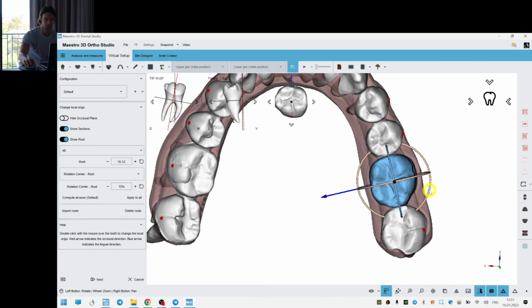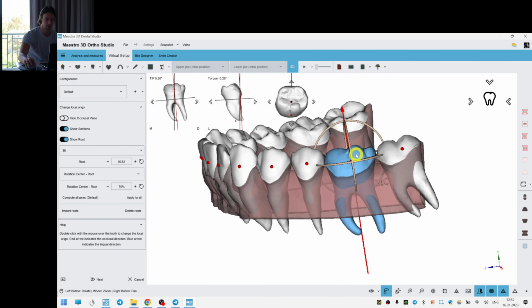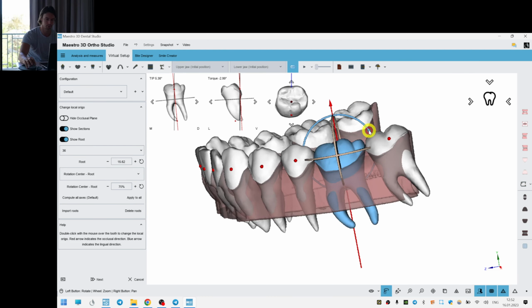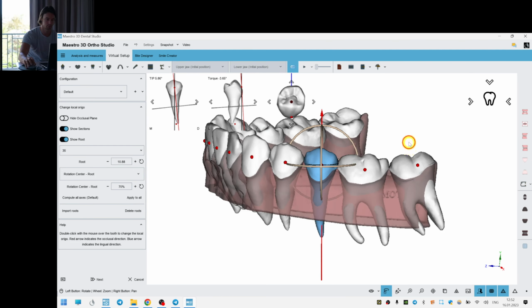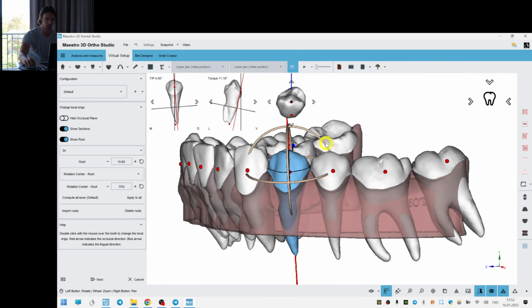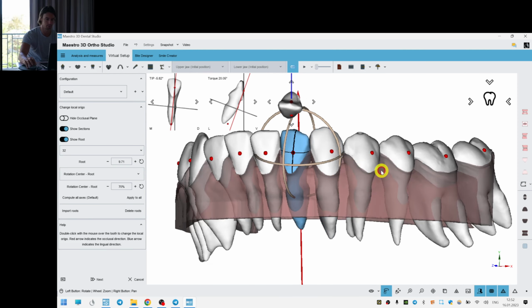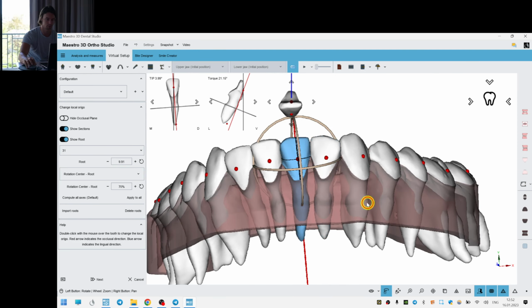I'm not a big fan of rotating the premolars and molars for like 3-5 degrees because it doesn't make sense, but makes the relapse, we have this way we have more chance of relapse, makes the situation less stable.